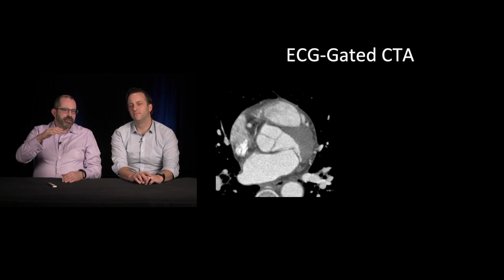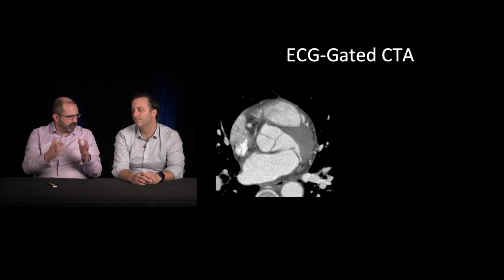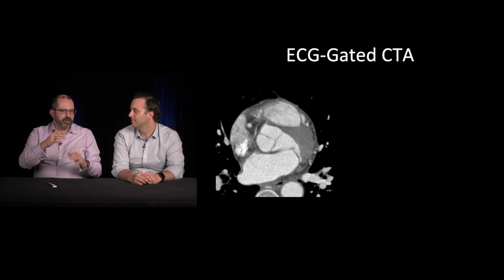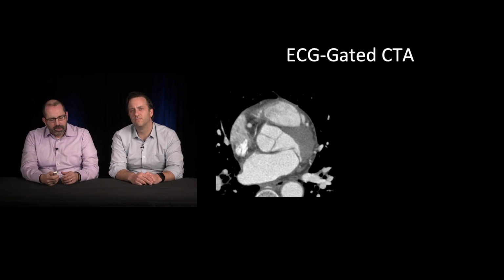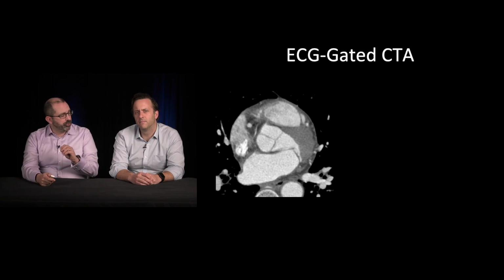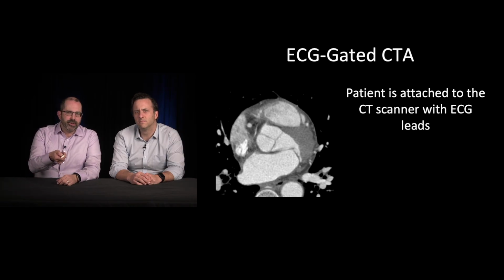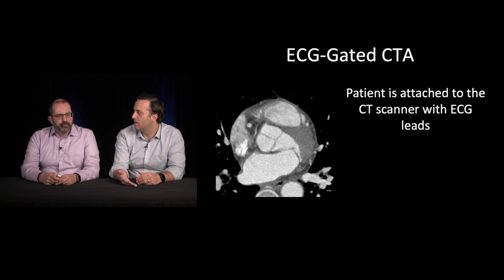That's awesome. This is the technique that they do when they're doing coronary CTs. Which sort of makes sense. You need a very still image to look at those. And so they do gated studies. Again, it's a little labor intensive. It's not something you're going to be routinely ordering on everyone, but it can be really helpful to decide, are we going to crack this patient's chest open or not in these equivocal cases? And you can see just how nice and crisp and clean, there's the aortic valve in full glory right there.